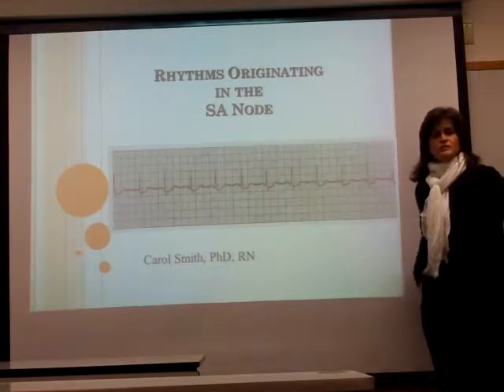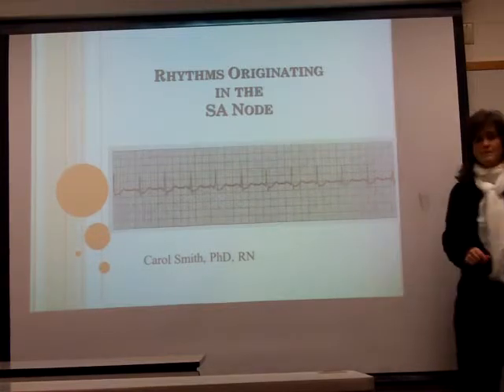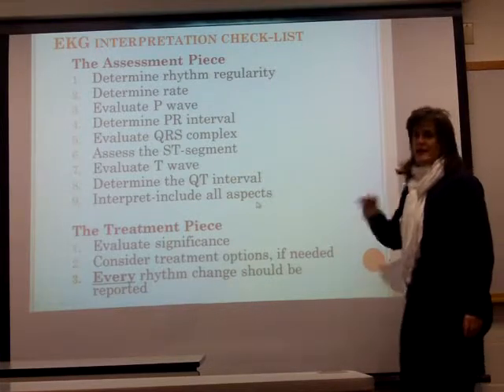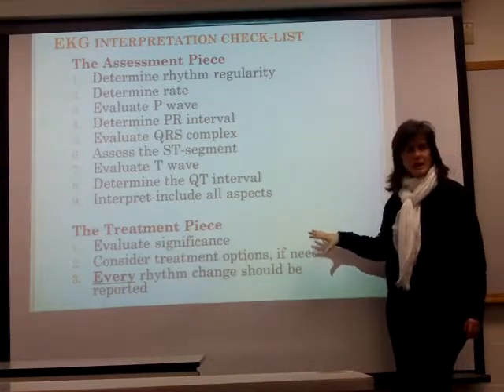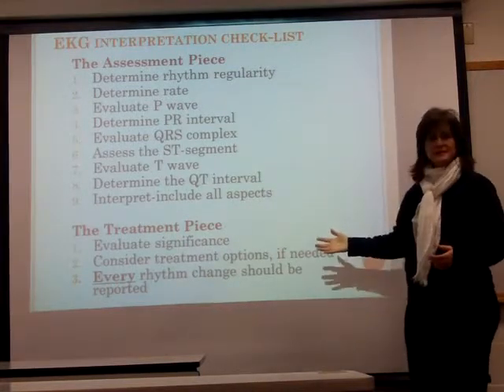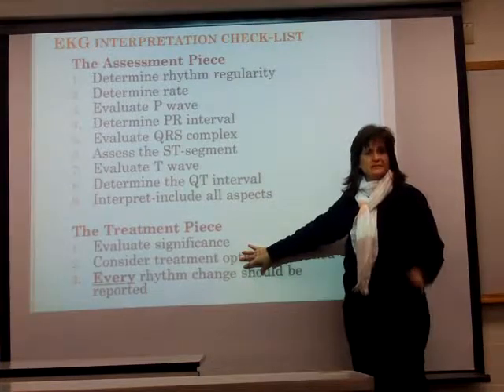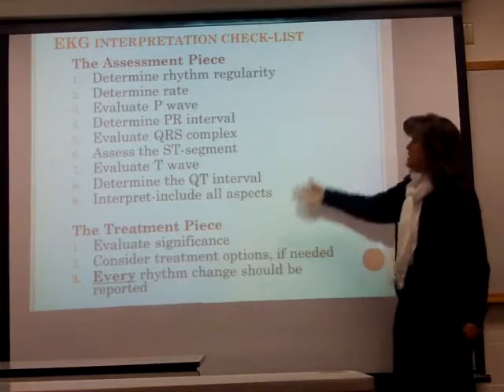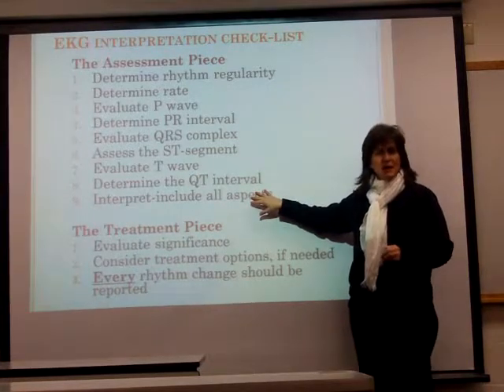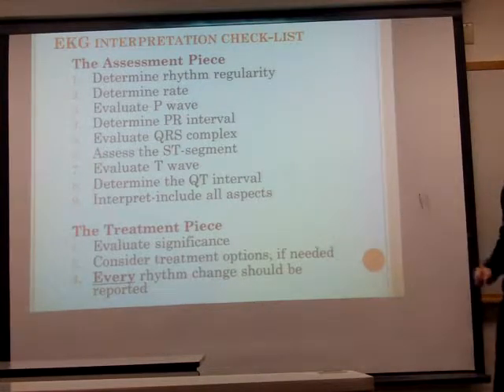Okay, this starts the first in our series of EKG interpretations. So we're going to talk about the sinus rhythms first. Now, as we've talked about in class, this is the sheet that I'd like you to have either beside you, pulled up on your computer screen, or you have written down these 9 steps here. And then, of course, we will go over the treatment pieces as we talk about each of the dysrhythmias. So these first through 9 stages will help you in a systematic way determine what the underlying EKG rhythm is. So very important you have that.